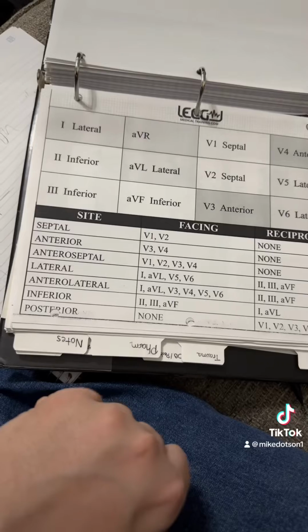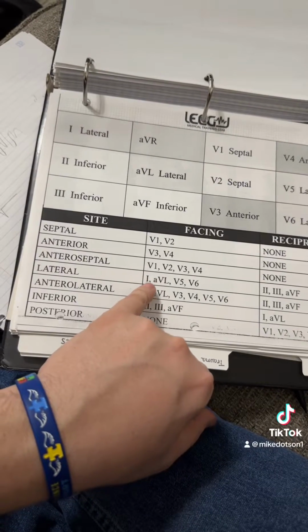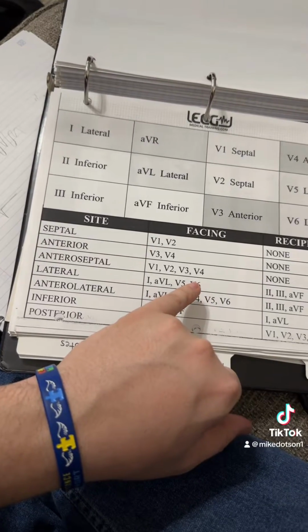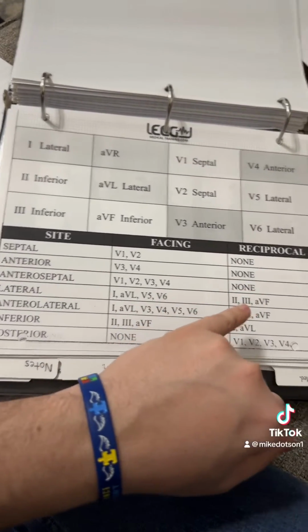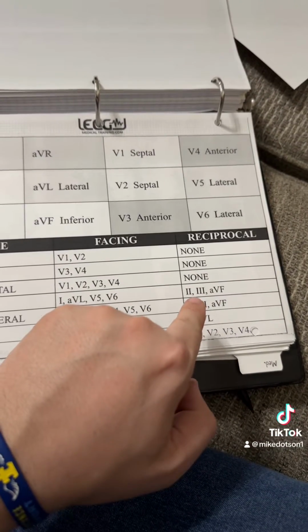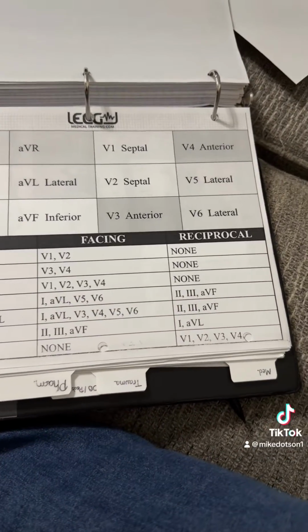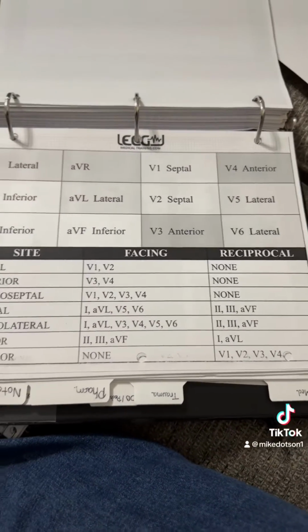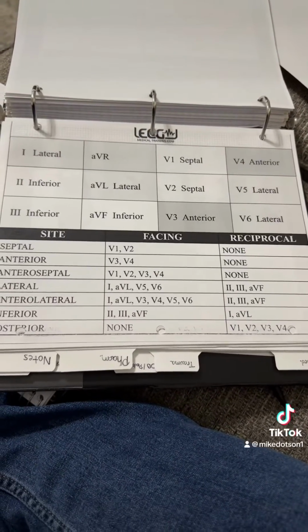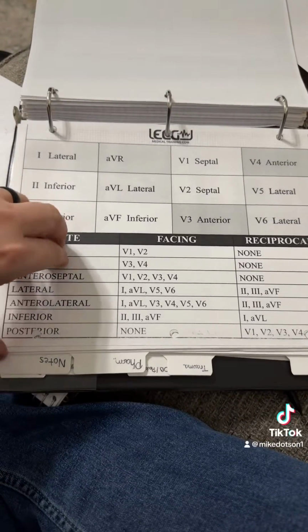If you look at this and you see a patient that is having elevation in lead 1, AVL, V5, and V6, you would see elevation there. In that case, you would see what's called a reciprocal change, which would be depression in leads 2, 3, and AVF. That's the only time where reciprocal changes and depression really matters. And that's really just more of a way to confirm the MI than it is to treat anything.